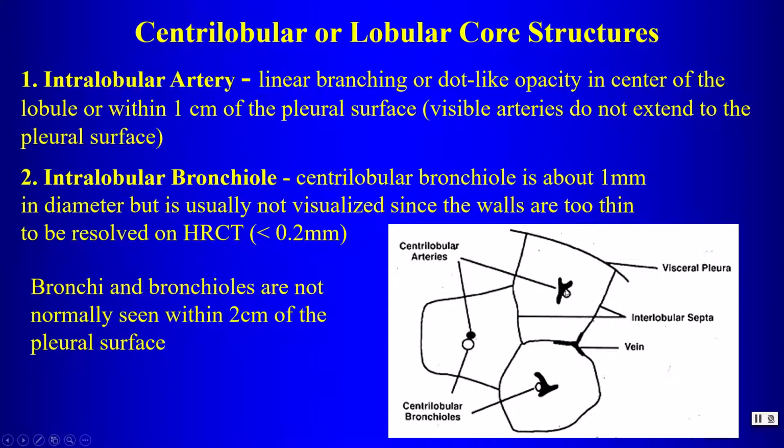Now, the intralobular artery will give us a linear or dot-like opacity in the center of the lobule on high-res CT. As you said, the intralobular bronchiole is usually not resolved unless there's something abnormal.